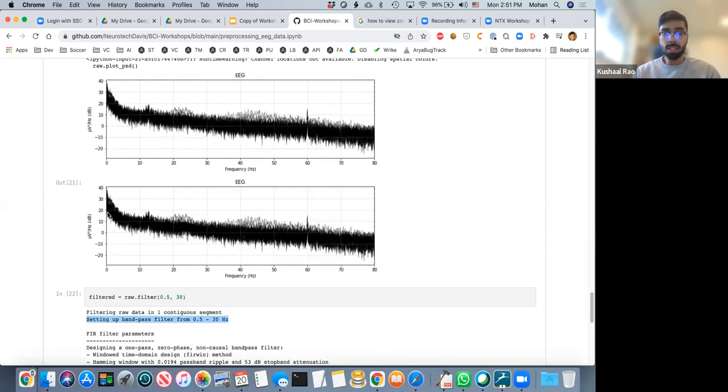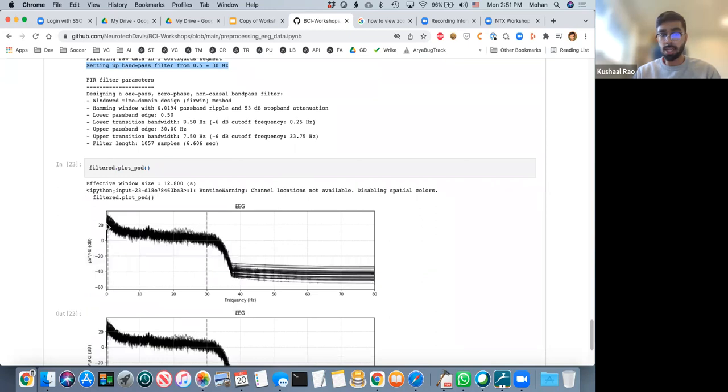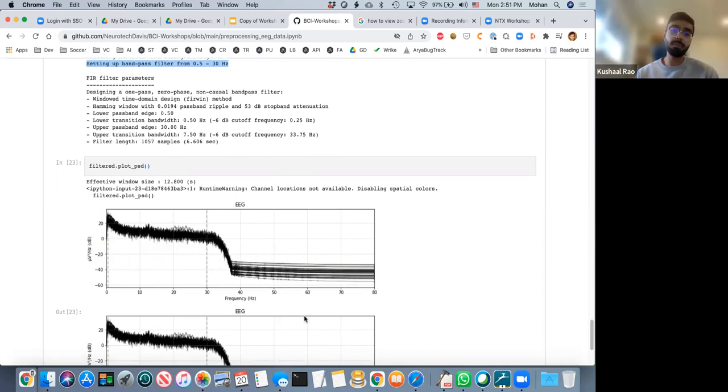Over here also, we see that it starts around 20 and goes a little bit below 0 around 30 hertz as well. It does start a little higher over here, but we've also started filtering out at 0.5, so that part has probably been cut off earlier. As for the rest of the graph, we see a gradual phase out up to about 38 hertz, and then it's completely flat, not a high power across all of these frequencies.